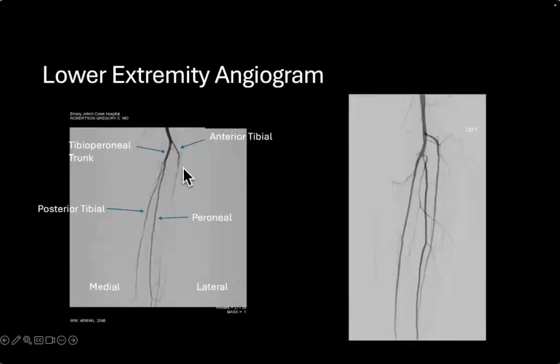We can see that this angiogram here is pretty extensive lower extremity peripheral arterial disease, particularly involving the anterior tibial artery, and the peroneal is actually pretty hypertrophied in relation to the posterior tibial. Here's more of a typical 3-vessel runoff on a normal lower extremity angiogram.